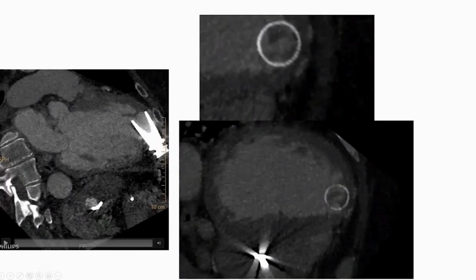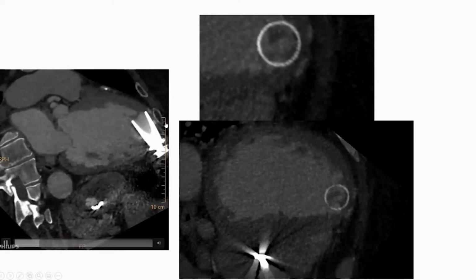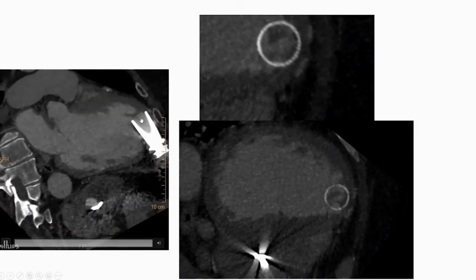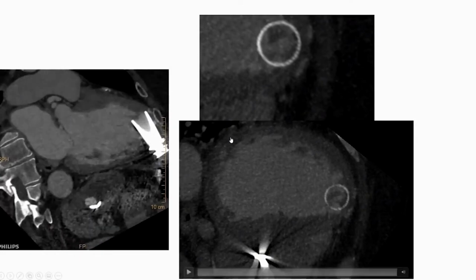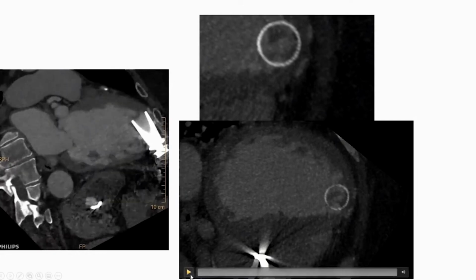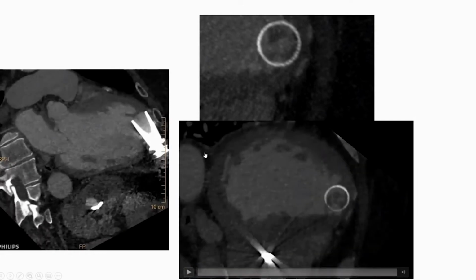So you can see right here, there's no clot. And essentially, this is probably suction, this is probably a triangulation into the inflow cannula tips, as you can see right here, causing the turbulent flow that we saw in echo.